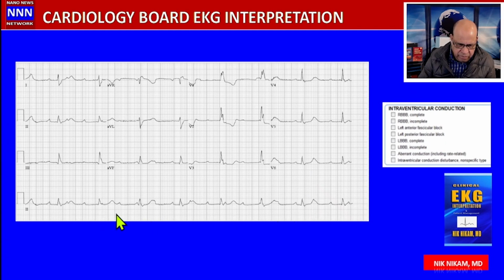So this is an example of a complete heart block with the right bundle branch block pattern. This is probably a junctional escape rhythm with right bundle branch block, unless it's not slow enough to be idioventricular. So this is right bundle branch block pattern junctional rhythm with AV dissociation and complete heart block because the atria are beating independently and there's no evidence of any fusion beat I can see. Otherwise, you would have seen a deformity in the QRS complex if there were some conducted beats.